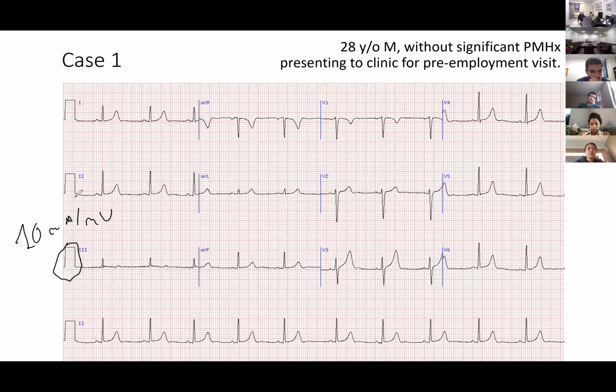I just go for the heart rate. So I see 3, 4, 5. I see a heart rate of around 60 to 75. Mm-hmm. So he's probably using the count-off method, as you know. So 1 big box, 2 big boxes, 3, 4, 5. So he's in between 5 and 4. So that's why he's saying 60 to 75 beats per minute.